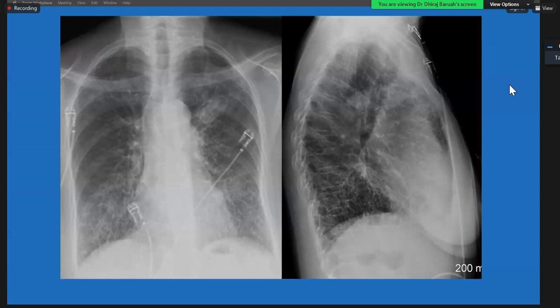And coming to this abnormality on chest X-ray, you see all the linear opacities out here in the lower lungs. There is some architectural distortion that you can see nicely on the chest X-ray, and these are interstitial opacities with some architectural distortion. Can you make a diagnosis of interstitial lung disease? Probably not on chest X-ray, but still you can suggest that this involves the peripheral lower lobe of the lung, and there is architectural distortion, probably some interstitial fibrosis going on.